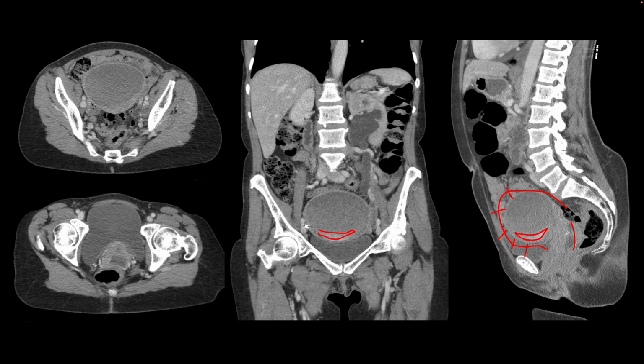And so this patient was later diagnosed with a cervical cancer, and that cancer was situated right there, obstructing the outflow of menstrual blood during the cycle at the site of the cancer, with progressive distension of the endometrial cavity and thinning and stretching of the myometrium that we see here. So when there is blood inside, it will measure high attenuation on CT, and the blood products will settle down by gravity, and that is called a hematocrit sign that we see here.